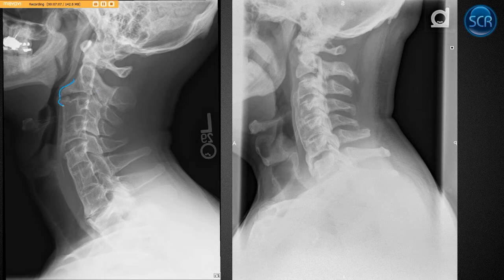This almost looks a little dishy, but this is because he has really extensive degenerative change in this one mobile segment that's present up here. He has another one mobile segment down here, and then has a fractured kind of marginal syndesmophyte down here. But the intervening areas are very characteristic of AS. Okay, so it doesn't necessarily have to fuse every level. It can leave a few open, and those open levels, of course, are going to become rapidly degenerative because they're the only ones taking up all that motion.